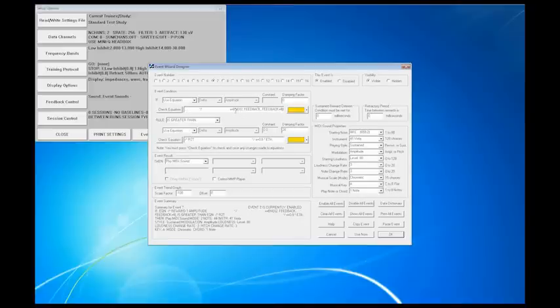Alright, here we go. So this is where we are changing where we're at. This is band number 2, and the range is feedback, and then feedback plus 4. So whatever feedback is right here is going to be the low, and whatever feedback plus 4 is going to be the high. And I think this is the exact same thing. We are looking at band 1. Now this one is feedback minus 100 minus duty, and then feedback minus 100 minus duty plus 4.